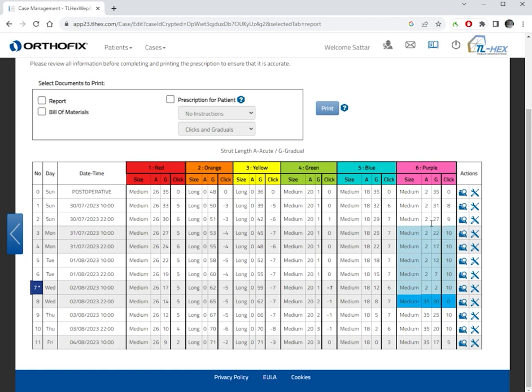The light blue is the time where we can change it. Darker blue is when we have to change it. The light ones are optional, you can change it if you wish, or you can leave it, but when you reach the darker blue, you have to change it. Not exchange it, adjust it. There's a difference between exchange and adjustment. Here we need to adjust it.